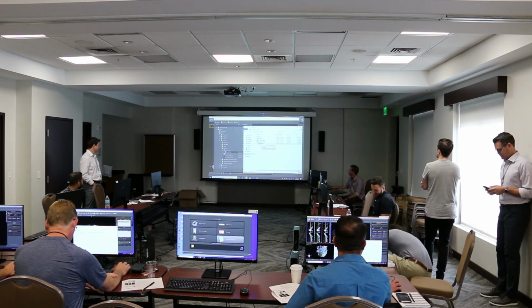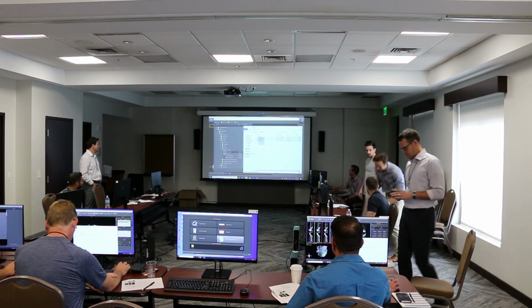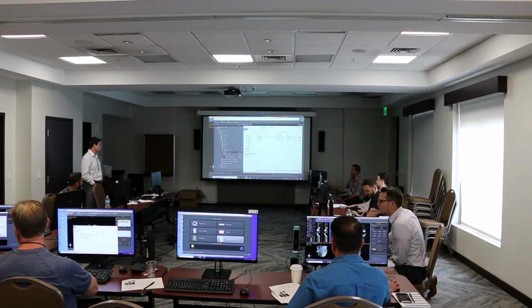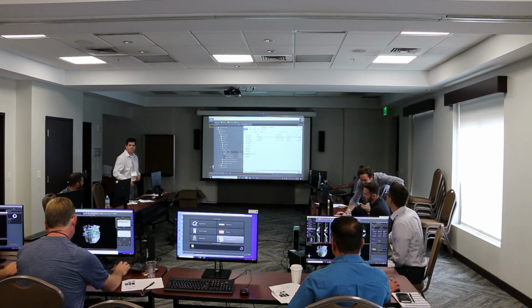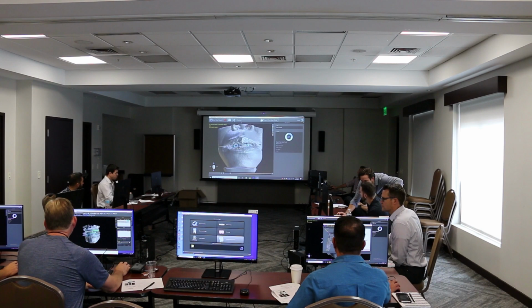It should be a folder that's called head3d.2obj, and it comes with these three things in it. Basically, it's a 3D object, a skin, a colored skin, and then I'm guessing this MTL file is like a merger. Yeah. So when you got your color, now it knows, okay, this is a face scan.